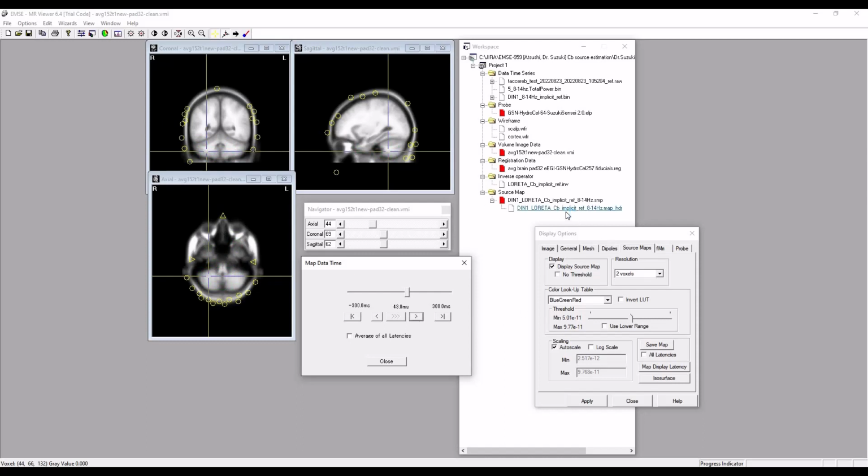Okay, so that's a first pass. And there are other things we can do. Now I want to return to this question of the reference. And we will need to discuss this, because the implicit reference seems to be doing a good job here. And by the way, how does EMSE handle the implicit reference? Well, EMSE is treating the implicit reference as if it were an infinity reference, an ideal infinity reference off to infinity.